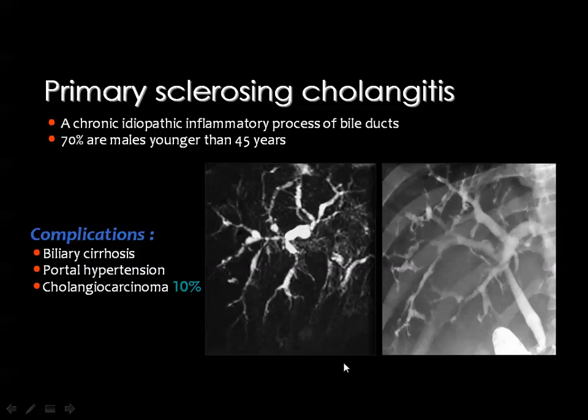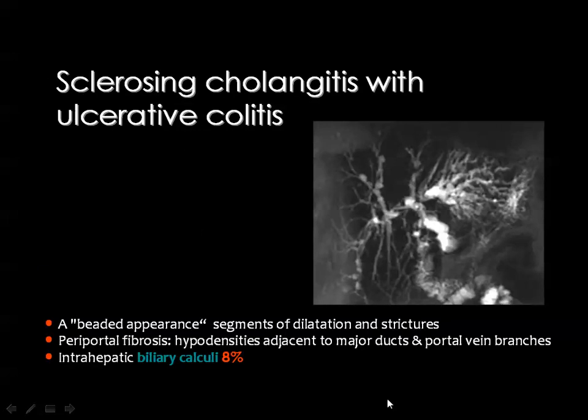And if you see, as I have said, multiple biliary strictures and dilatations, you know that you are dealing with cholangitis. And if you see stones, you may prefer the diagnosis of pyogenic cholangitis, although the sclerosing cholangitis may also be associated with some percentage of calculi.